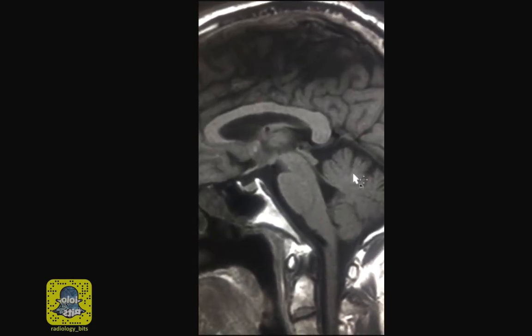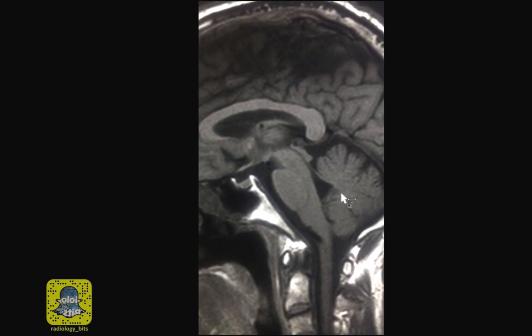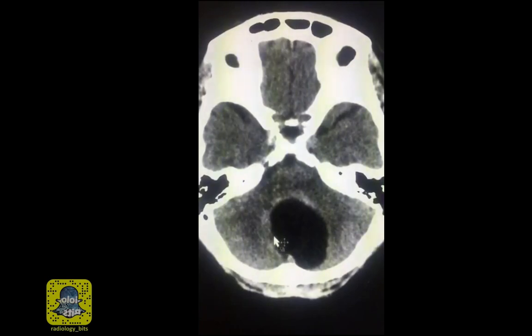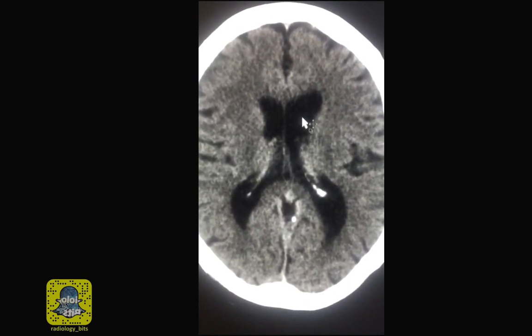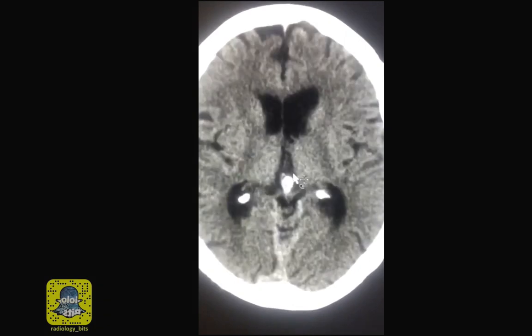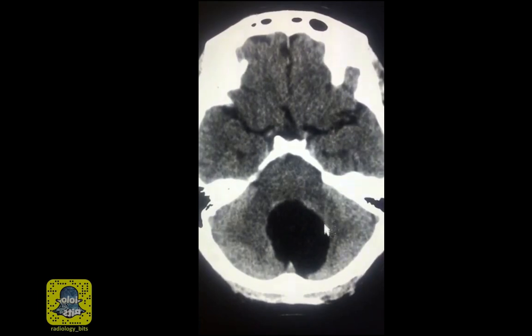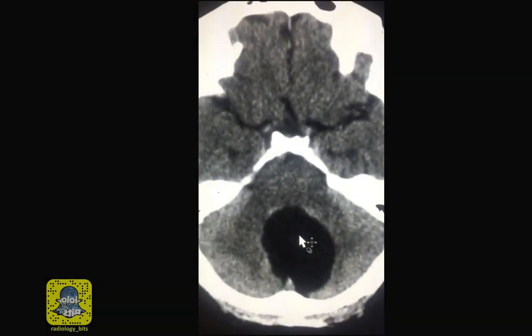Now that we're more familiar with ventricular, brainstem, and cerebellar anatomy, we could discuss the case that we started with. So back to our case, the abnormality is obviously seen in the posterior fossa here. On a CT scan, the CSF spaces appear dark. This is how fluid in the brain would appear, and the density of this abnormality is similar. So this well-defined rounded abnormality in the posterior fossa has an internal composition of fluid that simulates CSF. Now we know we're looking at a fluid-filled cystic abnormality of the posterior fossa.